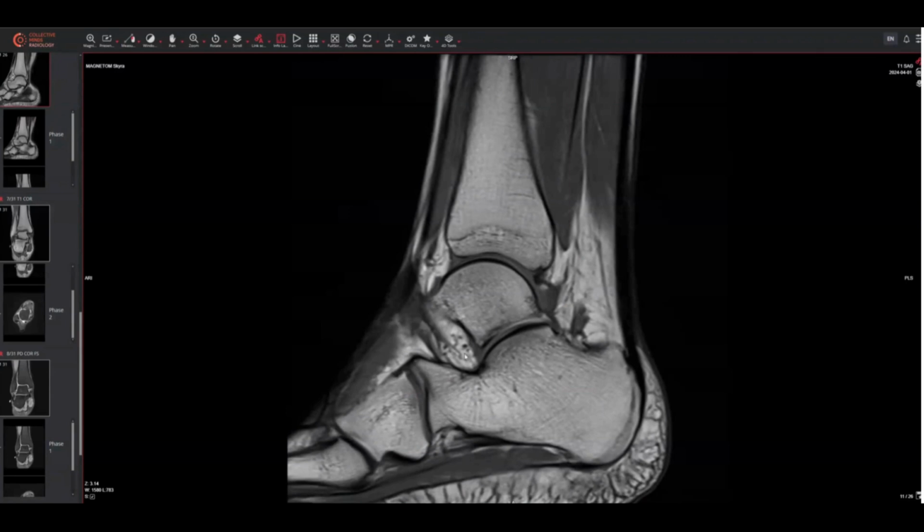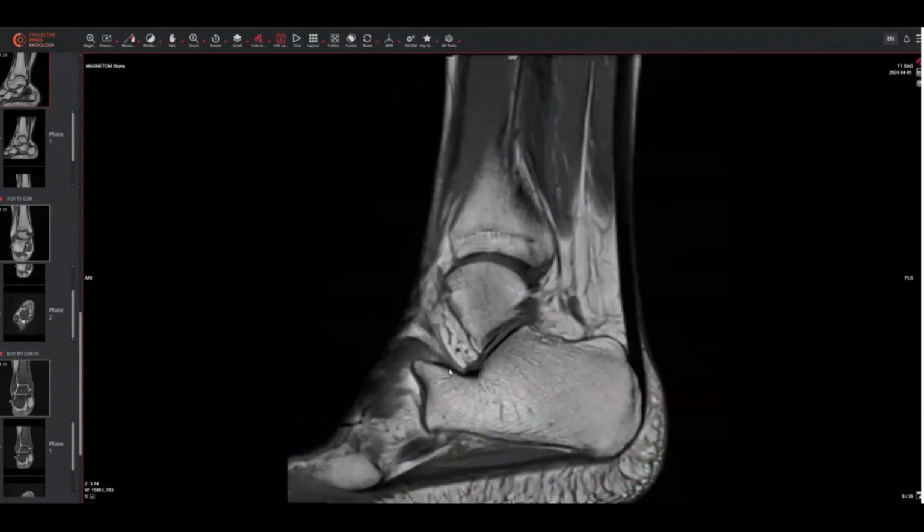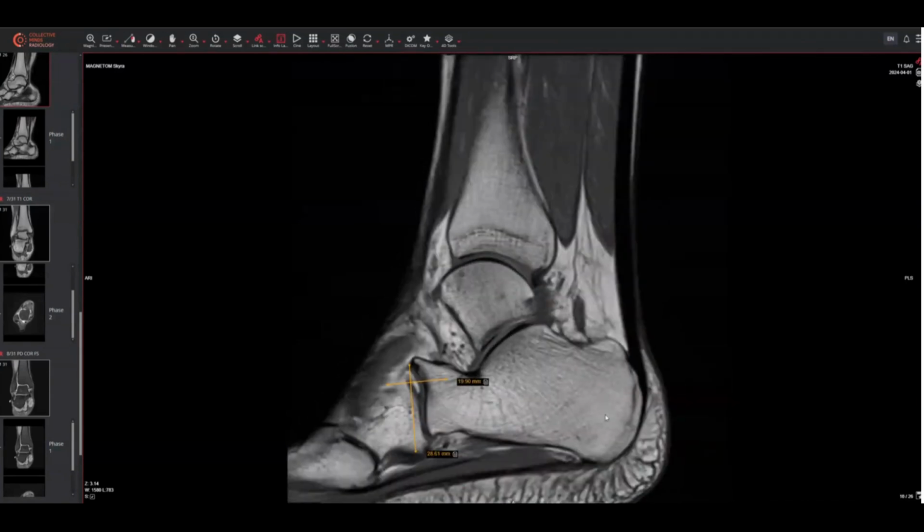One more confounding feature that I see in all of these angles is the relative attitude, whether this is a neutralized calcaneal attitude or it has an equinus attitude or a calcaneal attitude which is dorsiflexed.